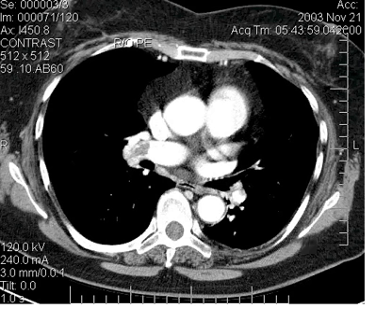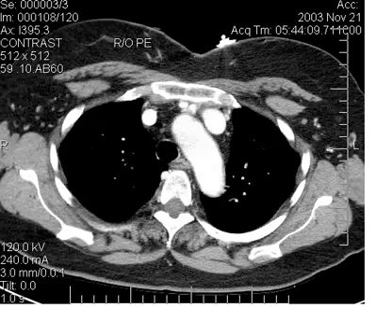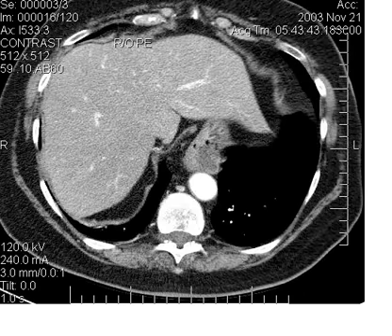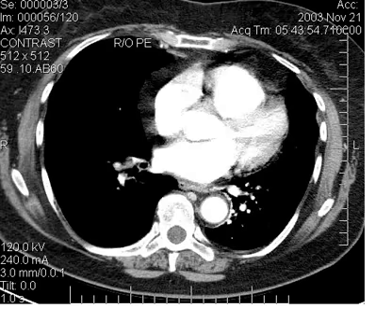Okay, I wanted to pick up, this is Dr. David Mintz, pick up where we left off. We'd gone over some normal anatomy, and here we have a positive study. So I'm going to do the same thing here, going to start off, this one goes from bottom to top, and kind of give you an overview of what we have here, kind of run through it.